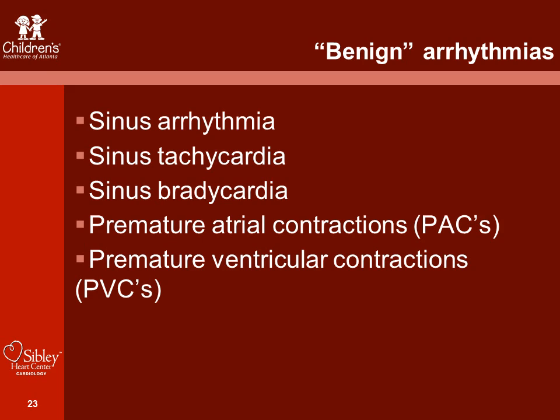Sinus tachycardia and sinus bradycardia are both benign arrhythmias. The reason why they're called arrhythmias in general is because the heart rate is outside of the normal limits. However, this change in the heart rate is not due to an intrinsic heart issue itself. It is due to an external factor that is influencing the heart, and the heart is responding. Premature atrial contractions are often considered benign, as are premature ventricular contractions.